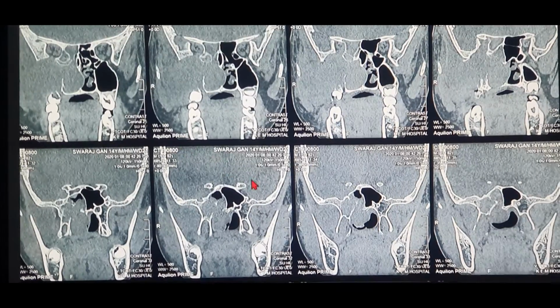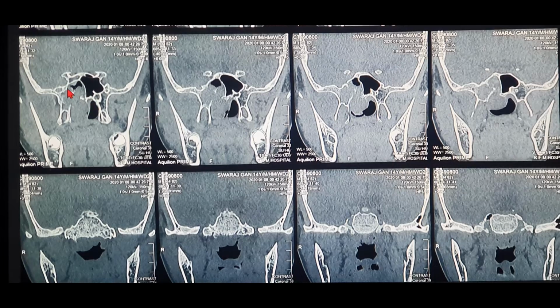Now I'm going to show you very clearly on the scans over here. As you could see over here, that was the area of the carotid bulge. That's the area of the optic. Now, the moment you start seeing the carotid artery on the lateral aspect of the sphenoid, that's the area of the cavernous sinus on the CT scan. So this area is the cavernous sinus, and what we have just below that is the pterygoid wedge. So once the pterygoid wedge is destroyed, it destroys everything over here and directly enters the cavernous sinus.